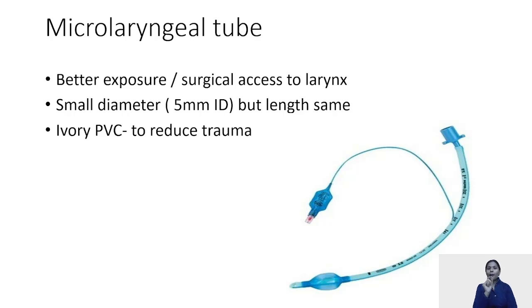The diameter is small, but the length is equal to that of any other PVC tube. This is made of a special type of PVC, the ivory PVC, in order to reduce trauma. I hope it is clear.